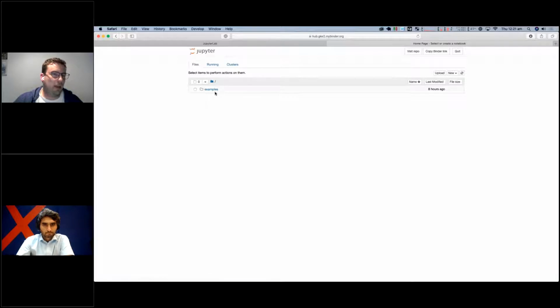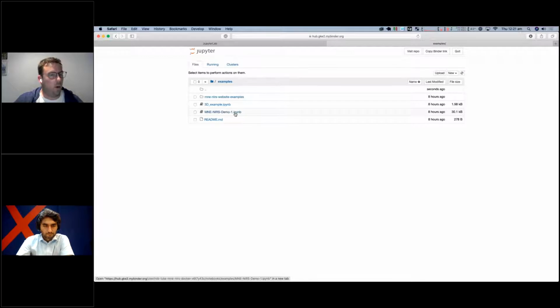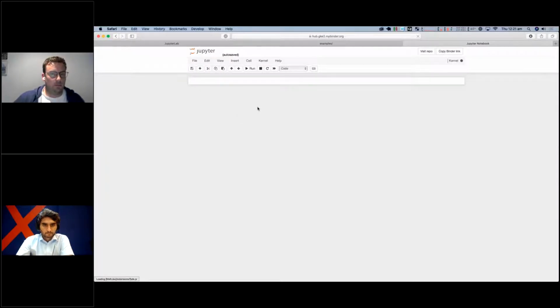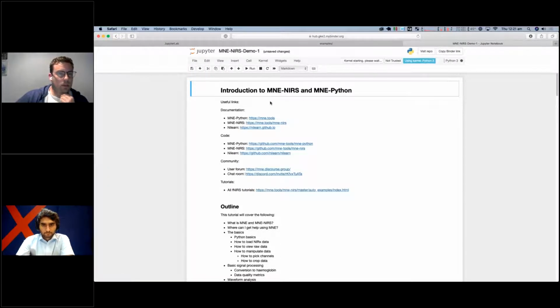Yep. To follow along with me today, click on the examples link, and then click on this MNE NIRS demo 1, and it will open up today's tutorial. At the top, I've provided some links to some of the websites that I showed you before.